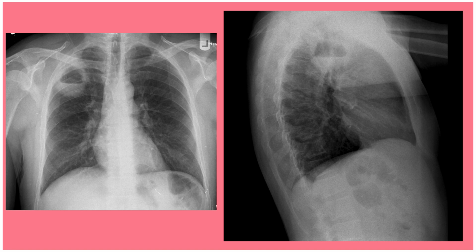And here we have another case where we have frontal and lateral views which show a thick-walled right upper lobe cavity lung lesion with air fluid level. And in this case, the patient is represented with upper lobe abscess of right lung.